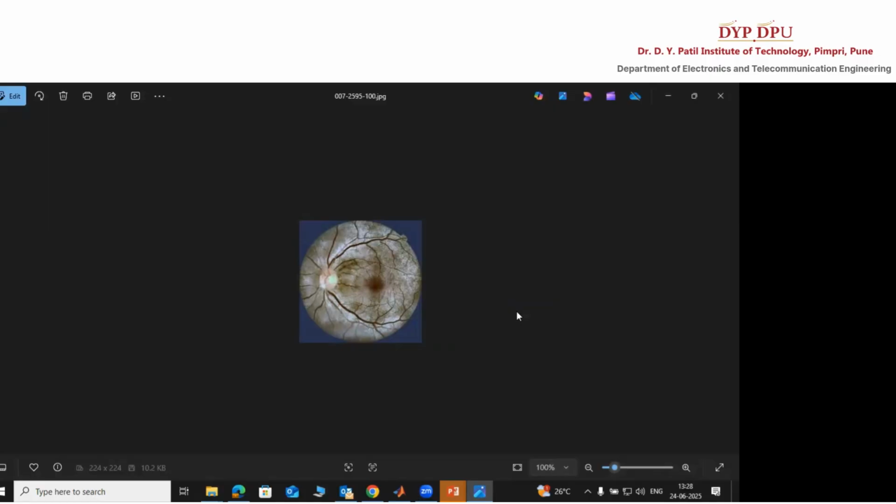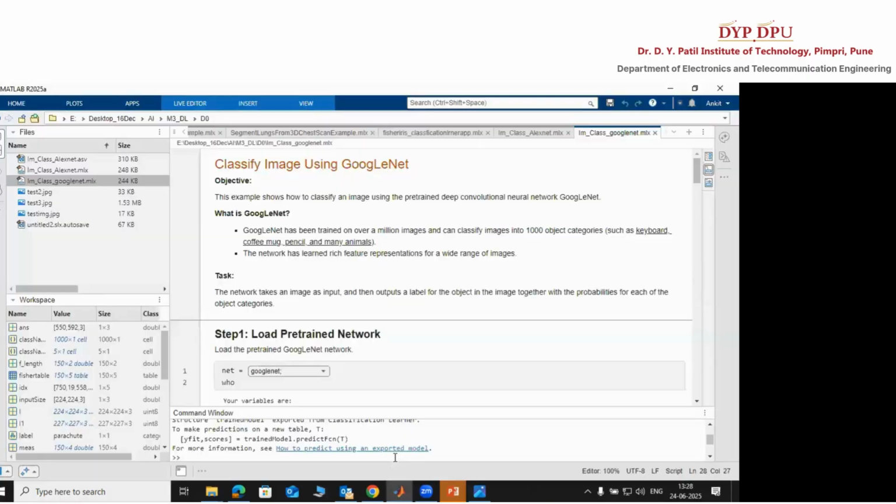Initially in the morning session, I talked about medical image analysis, import, volume segmenter, and the other things, and I have shared lots of resources with you. That is what I have done so far. If you want to explore these examples, I have shared the content with you.